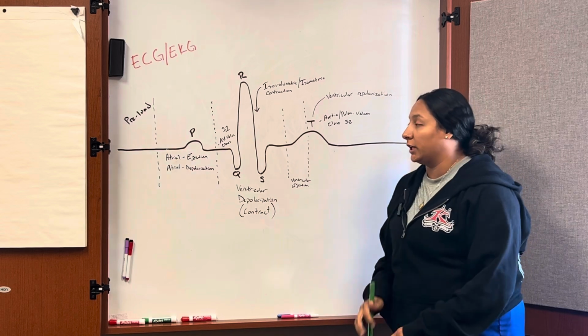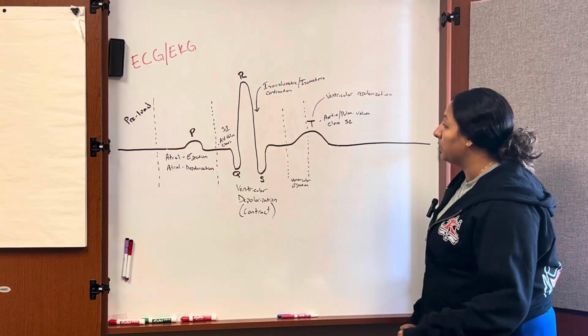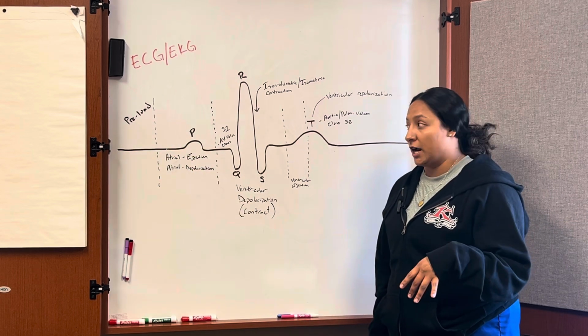Today we're going to be talking about the EKG, or the electrical flow of the heart and when it contracts. This is also known as ECG, the electrocardiogram. So this is kind of like the form that we'll be using. What we'll be starting with is over here with the preload. So that's just when the heart is refilling before the contraction.